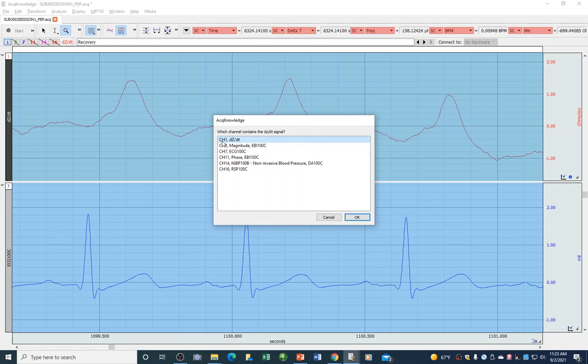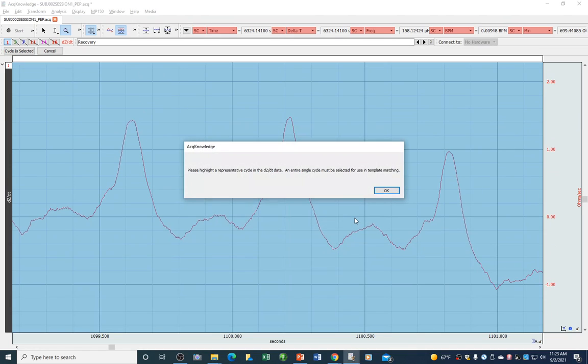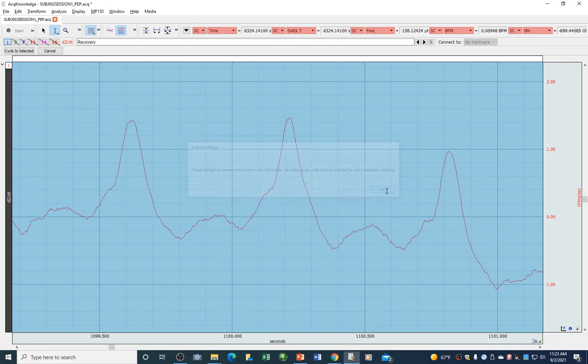Which channel contains a DZ/DT signal? That is channel 1 with the same name. Now which channel contains the ECG data? That is channel 7 in this case. ECG, you're always looking for the name ECG 100C. And now we need to highlight that representative cycle that we prepped up in the last video. So we'll say OK. You have to select one single cycle.